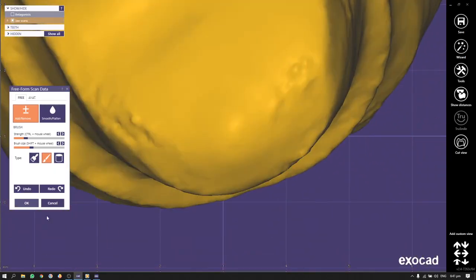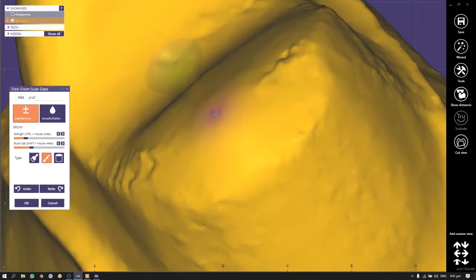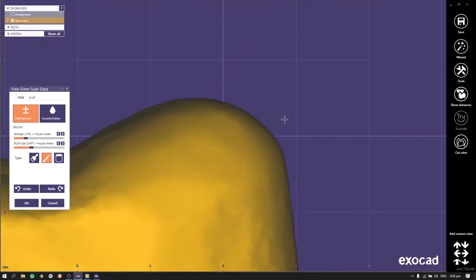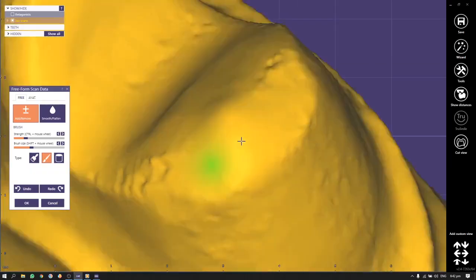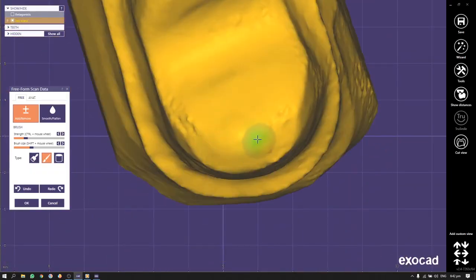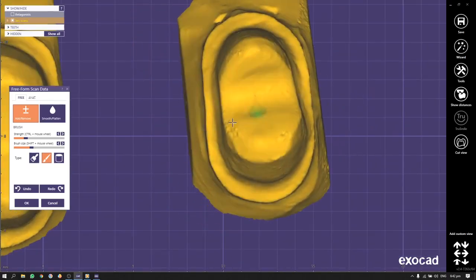It would be incorrect if, when we were filling the void, we decided to smoothen the whole stamp, because in that situation the geometry of the stamp would be different and the sitting of the restoration would be different. So we have to fill in the void only with adding. Click, click, let it be more cement. So there is no harm in that.